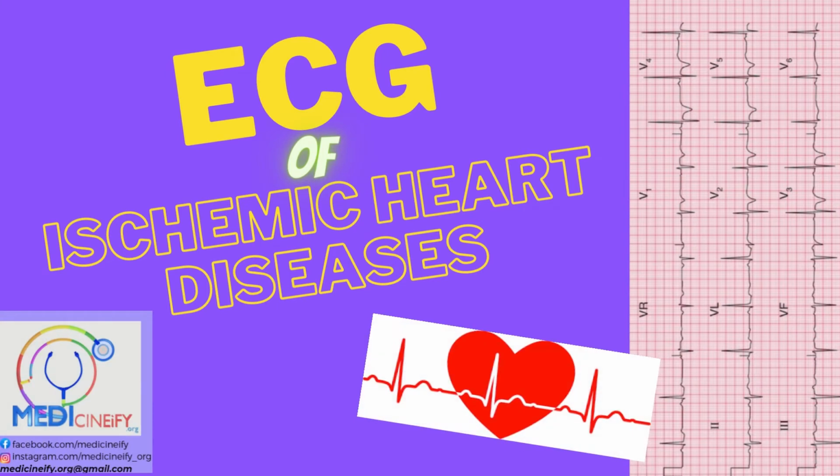ECGs of Ischemic Heart Diseases. You are back again with Medicineify Internal Medicine series, the ECG chapter. In this video, our aim is to provide you some examples of ECGs in patients with ischemic heart diseases.